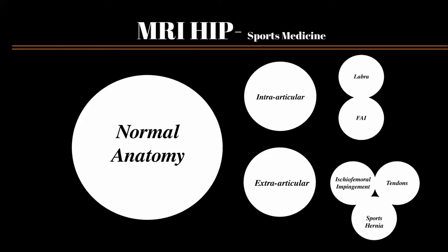Clinical diagnosis is difficult due to overlapping signs and symptoms, as you probably know. The hip is a complex joint and it's challenging to image too. Now, MRI is the modality of choice. It can evaluate the intra-articular and extra-articular pathology of the hip, and actually this is quite a good way of dividing what we find. You can also use MRI in hip replacements because now the newer MRIs have metal artifact reduction sequences, otherwise known as MARS sequences.